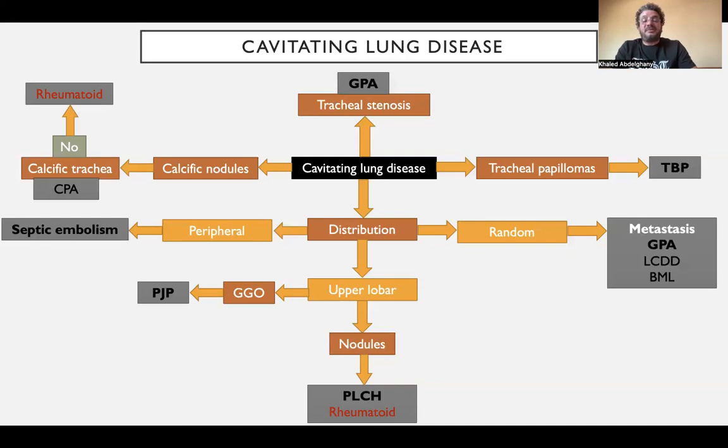The main presentation is interstitial lung disease, including UIP, NSIP, organizing pneumonia, but presenting with necrobiotic nodules is rare. And what is helpful for diagnosis of that is the presence of calcification of the nodules, whether calcified or not.